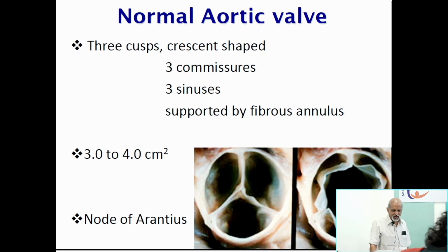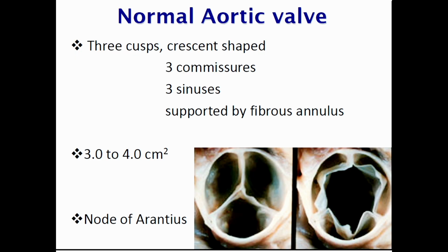So the normal aortic valve, it is a classic thing. Everybody should know that, because of the Mercedes-Benz sign. If you see this, then you will realize, oh, that is a Mercedes-Benz sign. Because every time people may not be aware what the Mercedes-Benz is, which is natural. I don't blame that. It is not that everybody should know about Mercedes-Benz.